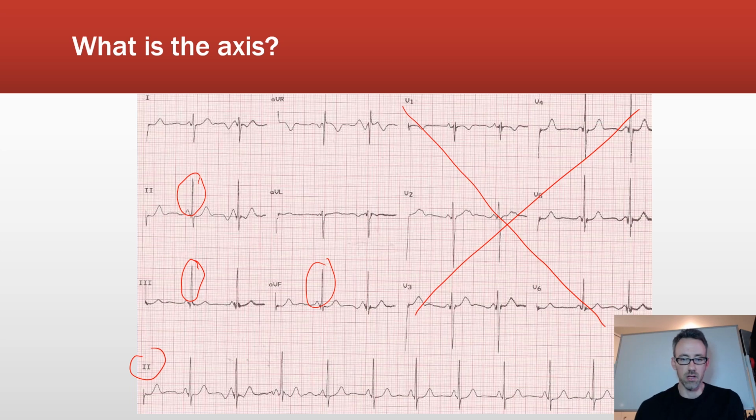Well, if I take a look, I don't have any good clean biphasic waves as I saw in the prior example. But probably not AVR, but if I look over at 1 over here, that's pretty close. Only I would say that downward deflection is probably greater than the upward deflection over here. It's a tiny upward deflection by comparison.